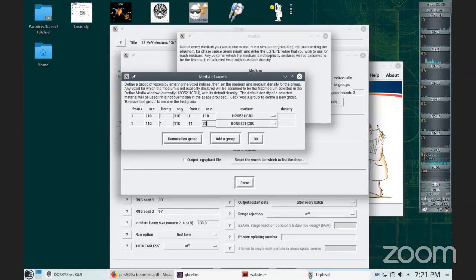Let's do something. I'm just going to draw something in the Z direction. We have these slabs, and each one is 1 millimeter. My drawing is bad, but bear with me. We said in the problem to insert bone in my phantom, starting from 1 centimeter depth, with a thickness of 1 centimeter, so it should go from 1 centimeter up to 2 centimeter depth.